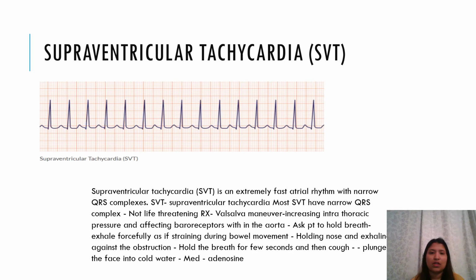Supraventricular tachycardia. In this rhythm, there is an extremely fast atrial rhythm with a narrow QRS complex. The QRS complex, you can see it is very narrow. It's not life-threatening.